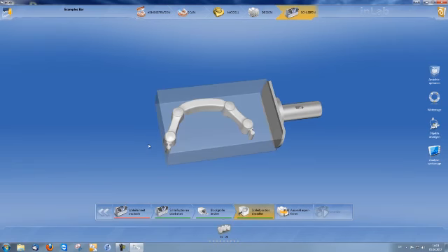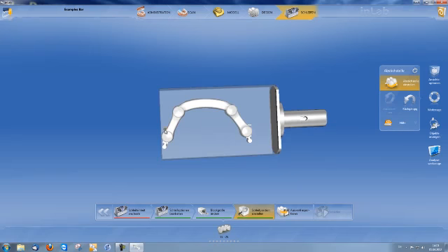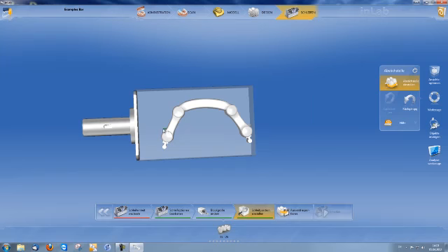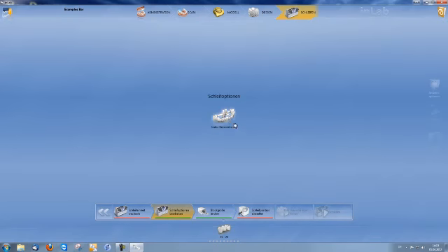I can also change the sprue location now via right-click, Sprue Location. The green area indicates where the optional point would be. If I click on this, it is changed. Finally, I can activate sinter support under milling options in order to avoid distortion when sintering.